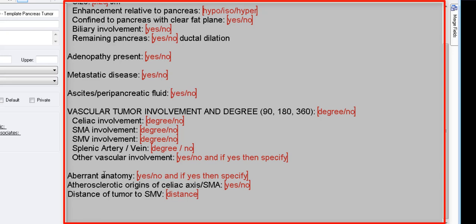the surgical approach. Similarly, if the tumor doesn't contact the SMV but is close to it within a few millimeters, it's important for the surgeon to know that difference, because occasionally they'll have to do jump grafts of the SMV to facilitate adequate surgical margins. Always comment on the origins of the celiac axis and superior mesenteric artery also, because if there isn't sufficient collateral arterial supply present, occasionally the surgeons can run into trouble if they need to cross clamp one of those arteries to control bleeding. So it's just important to bring it to their attention prior to the potential operation.